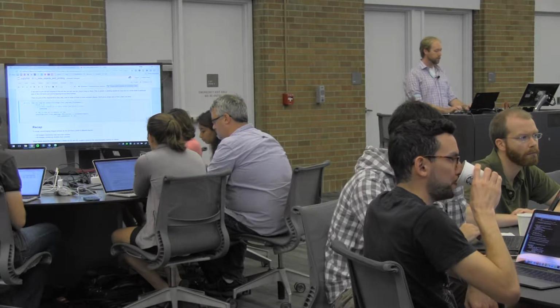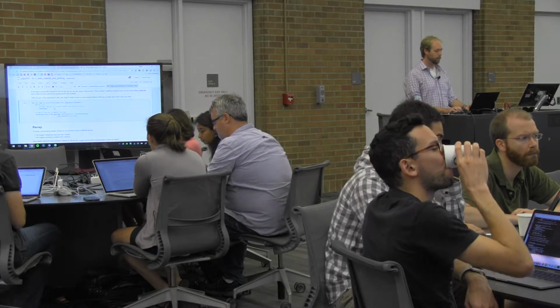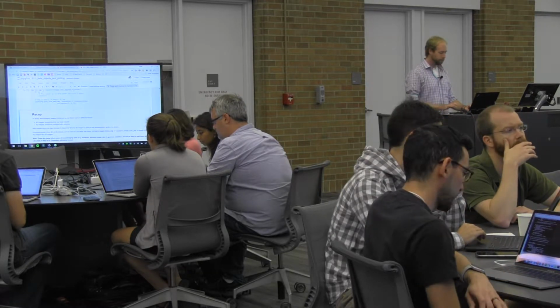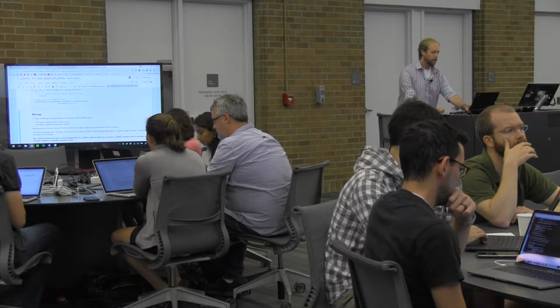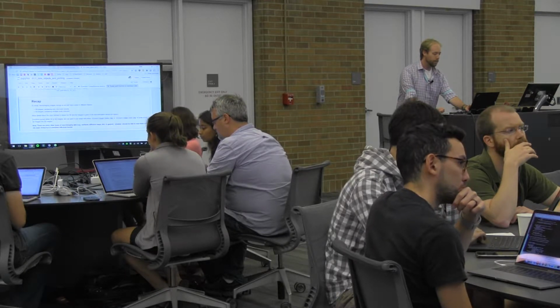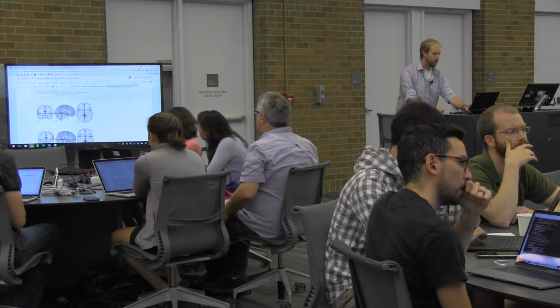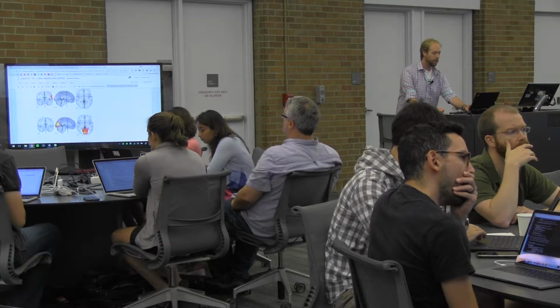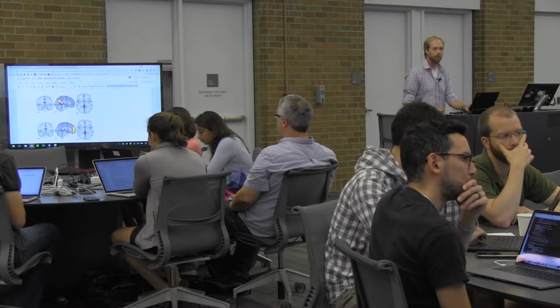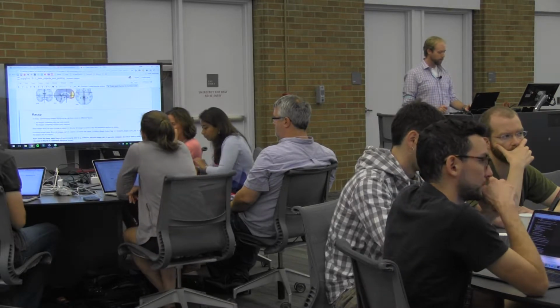So here I'm just going to iterate through the first 5 images that's inside this file name so that it doesn't take forever. And each time I'm just going to plot that image. And when I do that, hopefully this isn't going to take too long, you should get a visualization of the first 5 regions that this atlas is defining here. So that's a nice way that you can just quickly parse through the data in order to get what you want out of it.